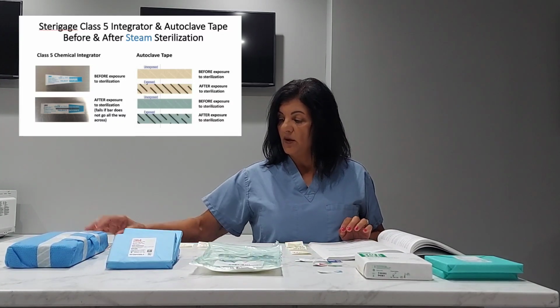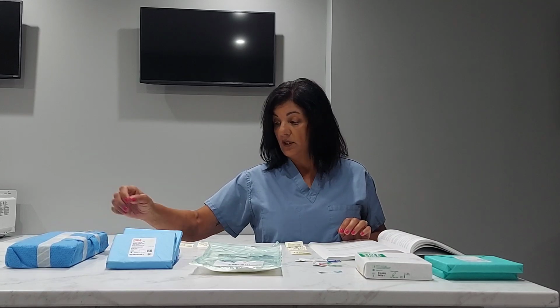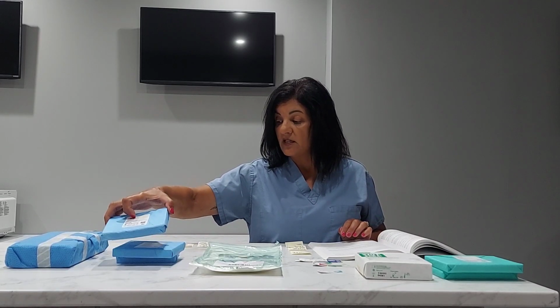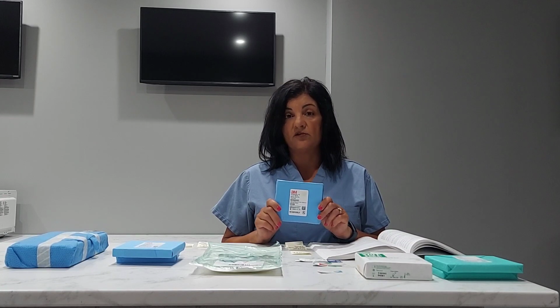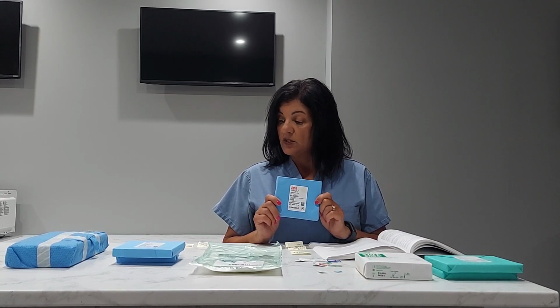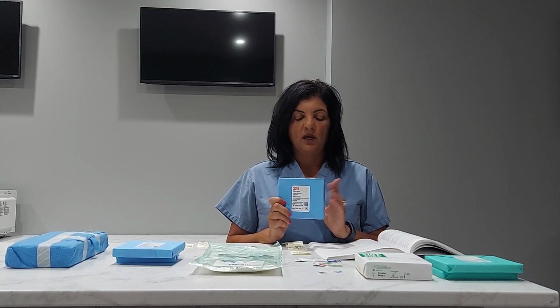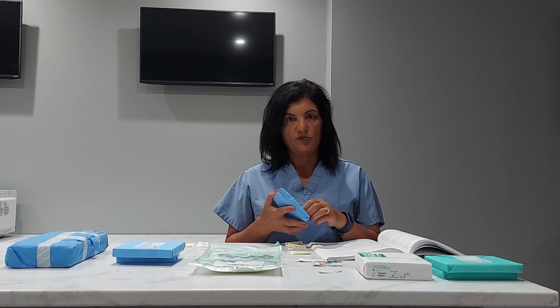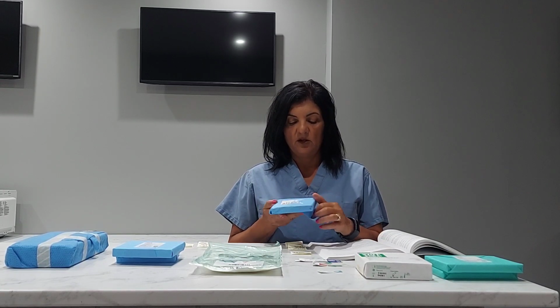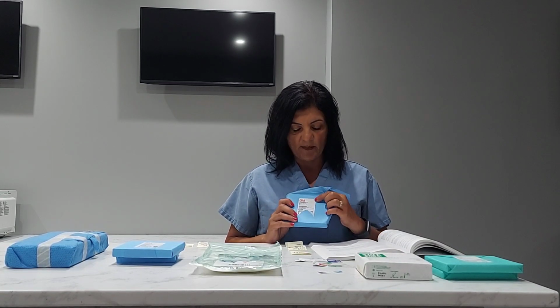So the second type of indicator is a class 2, and typically a class 2 is used for specific test procedures, and a class 2 would typically be your Bowie-Dick or your DART test. DART stands for Daily Air Removal Test. This is a procedure that is being done in your sterilizer. So a Bowie-Dick or DART test is also a process challenge device.